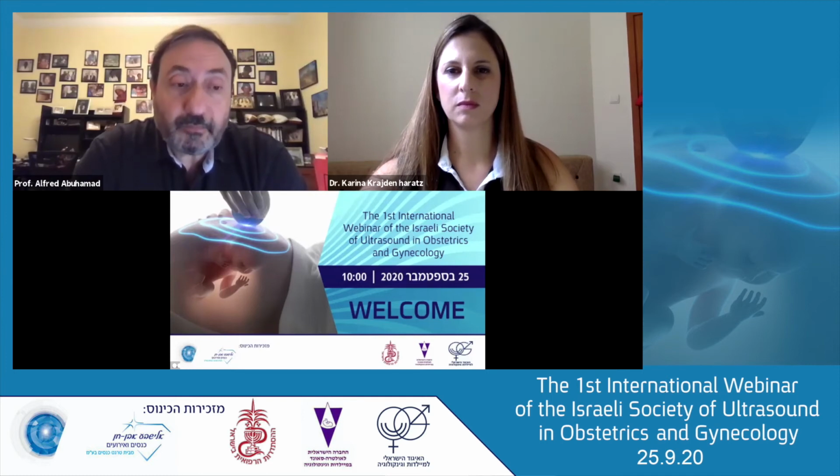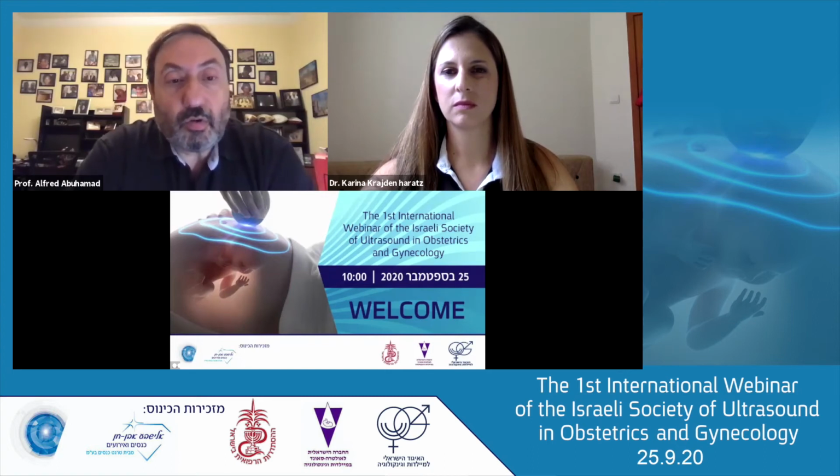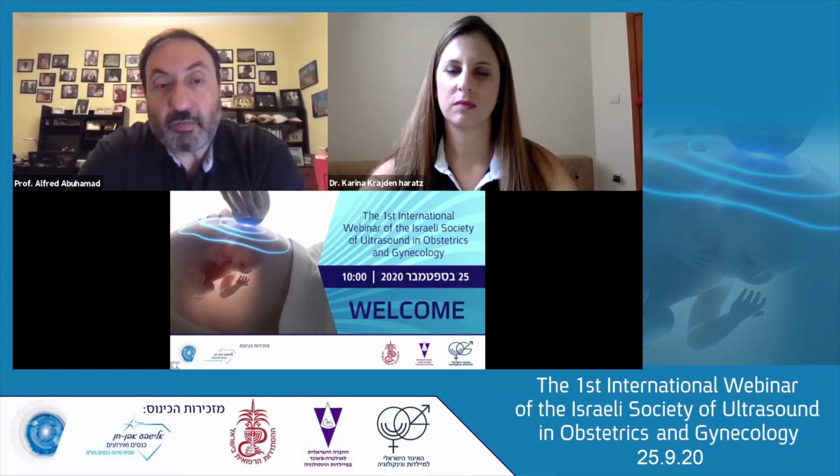There are charts to measure the aortic isthmus with regards to its size, color. The pulse Doppler will show increased velocity through it in the presence of narrowing. But typically in my lab, we rely on visually seeing a small aortic isthmus and looking at the color Doppler to make the diagnosis rather than more specific measurements.